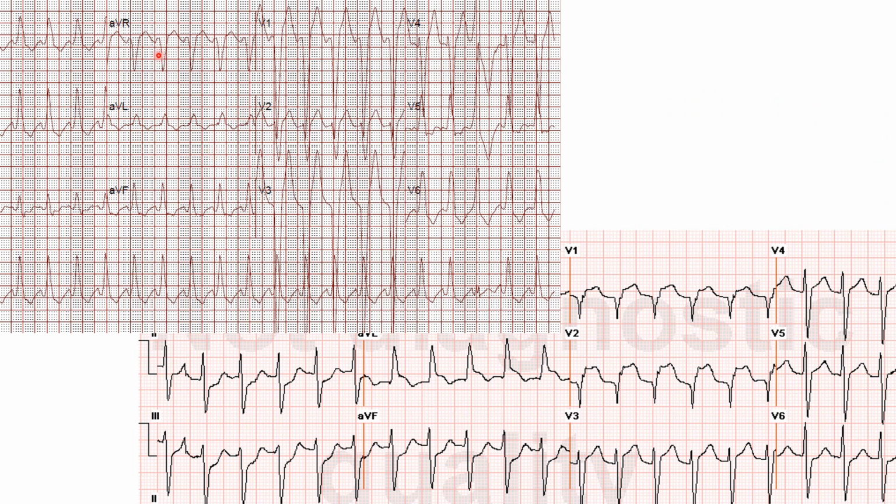This is the first patient I showed. He has discordant ST elevation over 5 millimeters, yet the ratio is barely 10%. This patient does not have a STEMI. He has malignant hypertension with hypertensive cardiomyopathy. This illustrates the importance of relative discordance as opposed to absolute discordance. This patient has a huge S wave and the discordance ratio is barely 10%. Conversely, this is the last patient I showed. She has discordant ST elevation less than 5 millimeters, yet a ratio that exceeds 25%, and she has anterior STEMI.